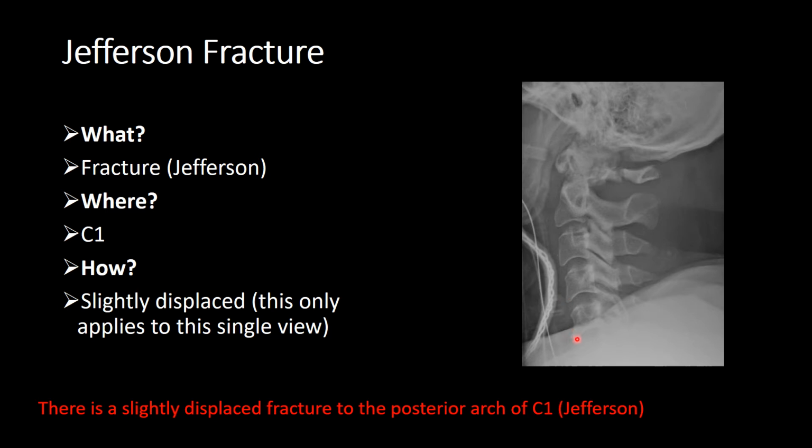This appearance, this slightly spur-like projection, these are spondylotic changes. This is an osteophyte, so it mustn't be misconstrued as creating a curvature to the anterior longitudinal line. We just go down the anterior bodies, cut off that little spur and keep following down. So this is a normal anterior vertebral line.